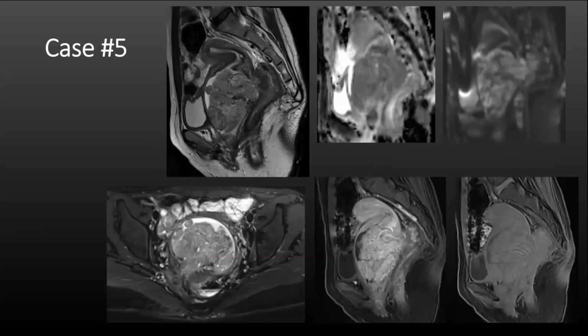And this is the MRI of the case. So what do you think is the most likely diagnosis?